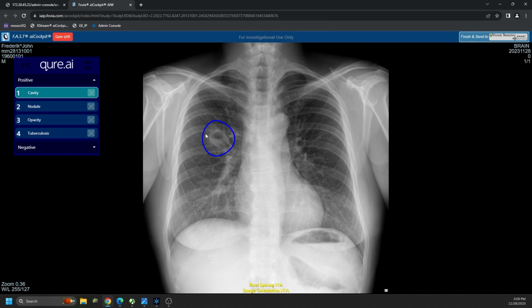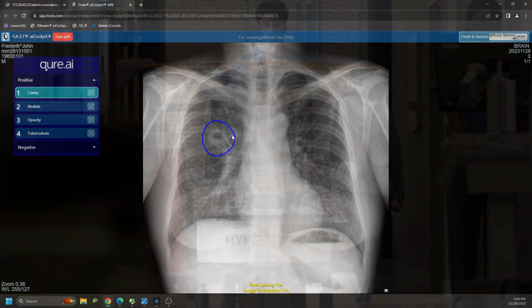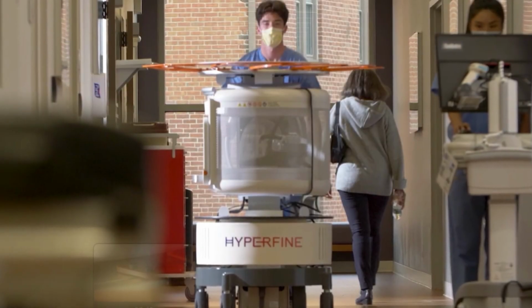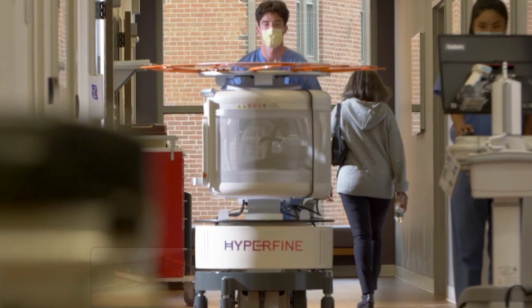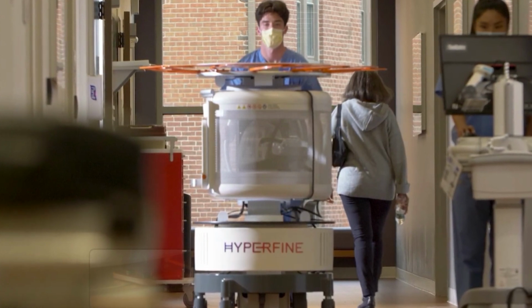The ED physician later orders a chest CT, which confirms the finding, and unfortunately, the final pathology reveals a lung cancer. That brings us to a close for our thoracic imaging for our patient, and we'll move on to the clinical symptoms that brought him to the ED in the first place, his left-sided weakness.